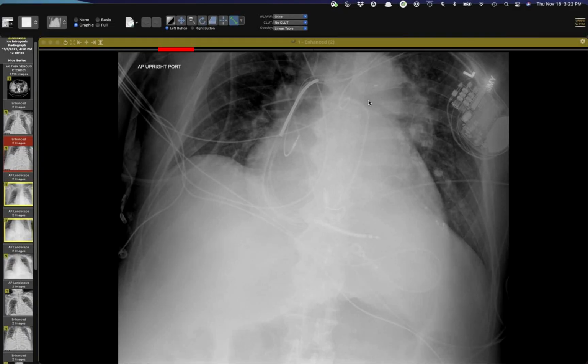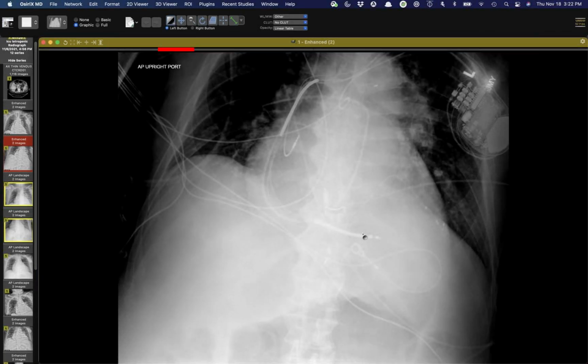All right, I've got a couple of balloon pump cases. You know, we still find these to be perplexing sometimes. And I'm going to start with this one. And you can see this person's obviously got some cardiac issues. They've got a pulmonary artery catheter in. And you notice the proximal portion of this intra-aortic balloon pump is slightly more horizontal, or almost even angled inferiorly more than it should be.